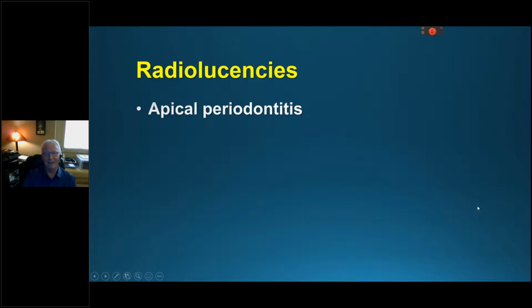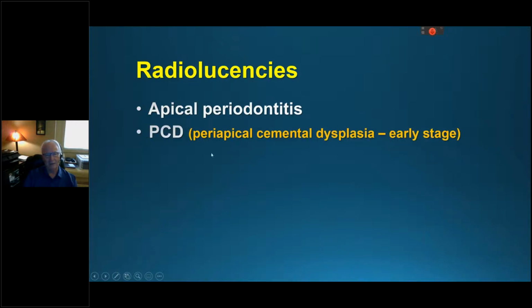But let's start in. Apical periodontitis, a generic term for the changes that occur at the apex of a tooth as a sequela of pulp death. You know, pulp dies, you get abscess, which you don't really see much radiographic change, then onto a granuloma, which you do, and then onto a cyst if the body's trying to wall it off and forming a cortical margin around it.